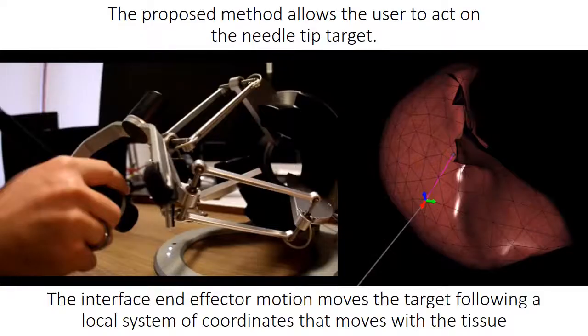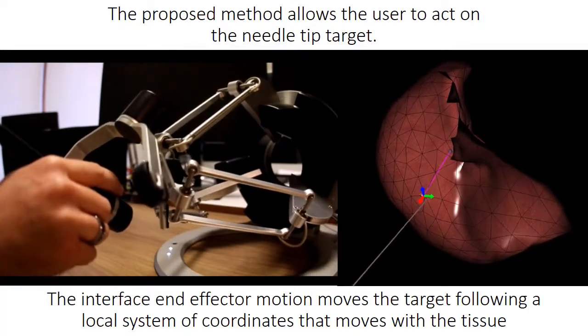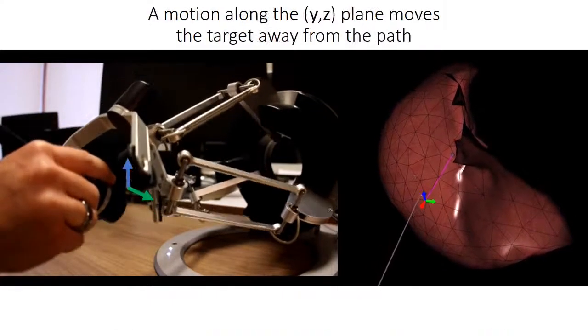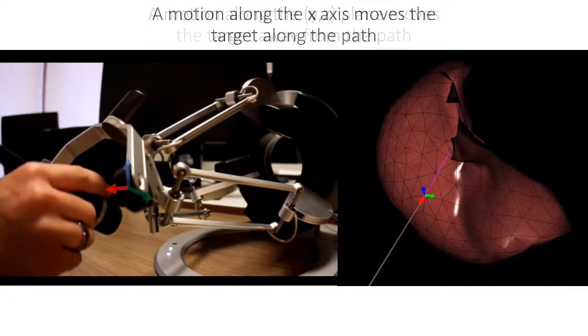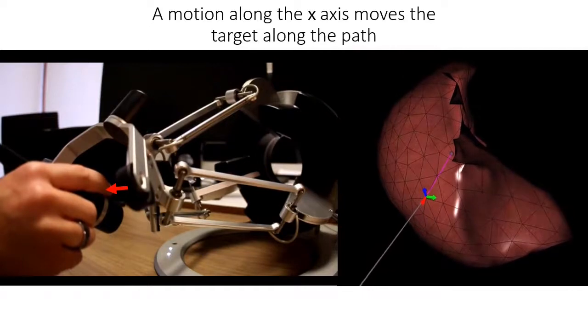The proposed method allows the user to act on the needle tip target. The interface end effector motion moves the target following a local system of coordinates that moves with the tissue. A motion along the YZ plane moves the target away from the path. A motion along the X-axis moves the target along the path.